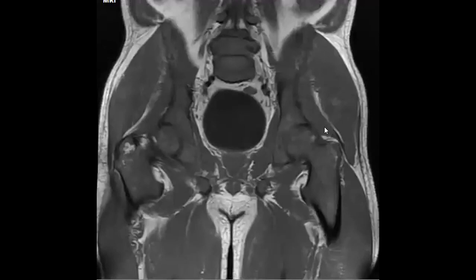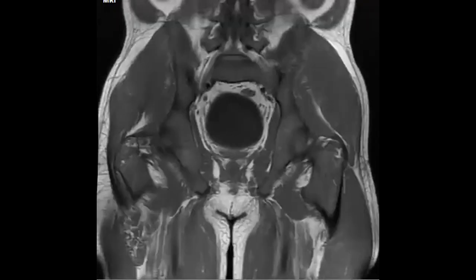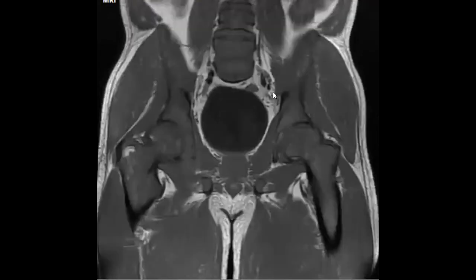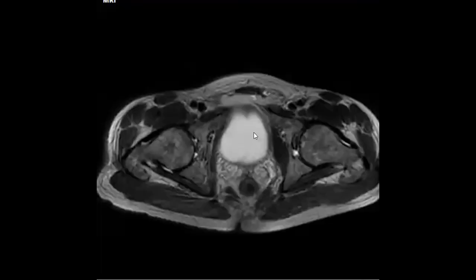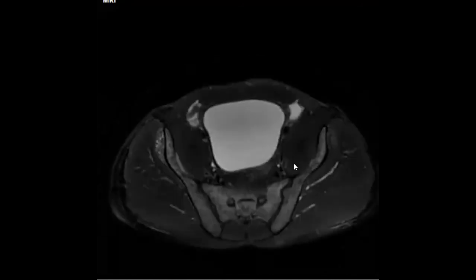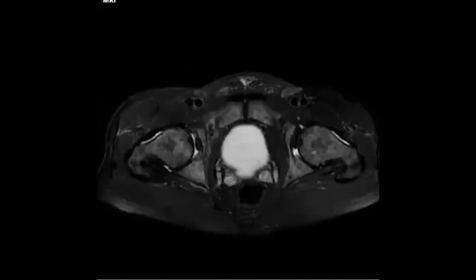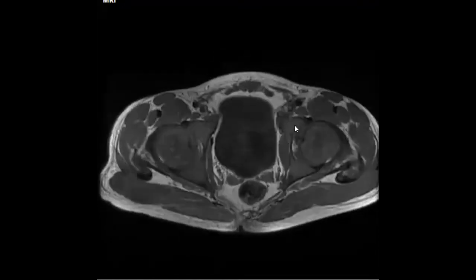So if you go to the T1, there is diffuse low signal marrow. Do you agree with me? Yes, Rania, perfect. So if you agree with this, I think you will think about what is called bone marrow infiltration. And if you go to the other sequences, you will find abnormal low signal, a mottled appearance, and very low signal of the marrow. Usually, you will find that the marrow has fat like this. And when you find that it lost the fat, this means that it could be infiltration.